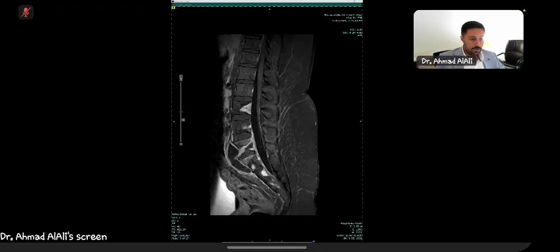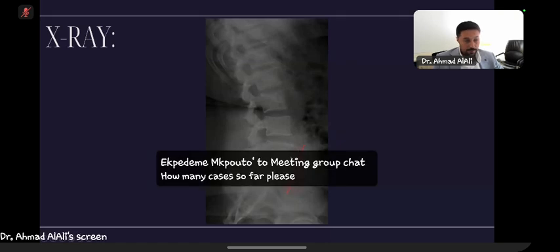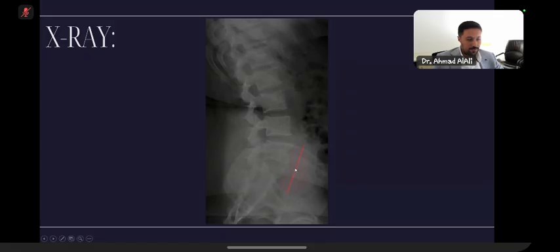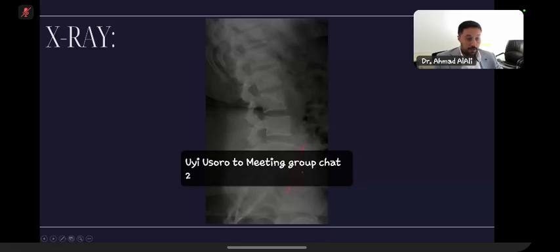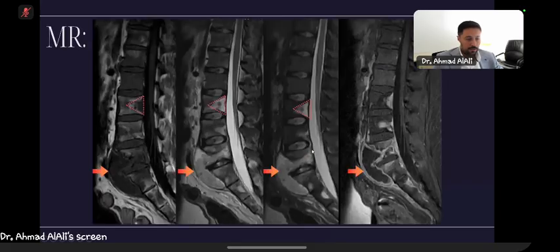Okay, that's great. So, to summarize the case, I would like to take a second and share a few things. On the lateral radiograph, there is some soft tissue opacity anterior to the L5 and S1 vertebrae. It's very subtle and very difficult to detect, but if you go retrospectively from the MRI images back to the radiographs, you can probably see some opacity anterior to these vertebrae.